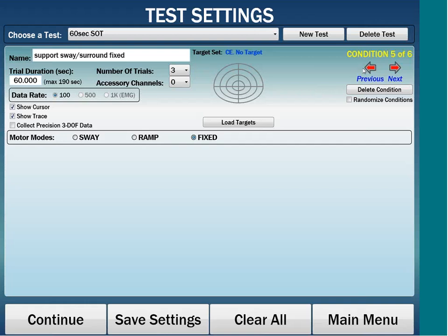And when I click on Export, since I have collected data on both the dynamic system and the static, they are both written to Christina's file. And when I export the data, I will have access to both dynamic and static. So now we already have a file for review, and here we are.